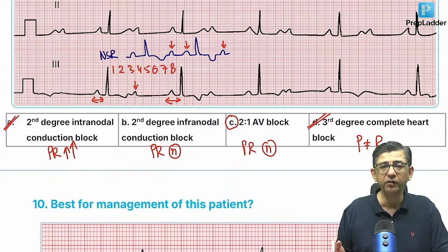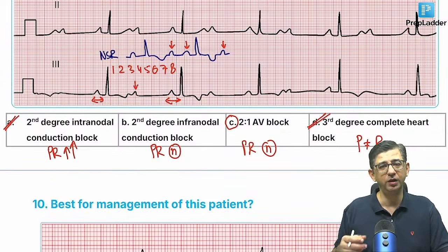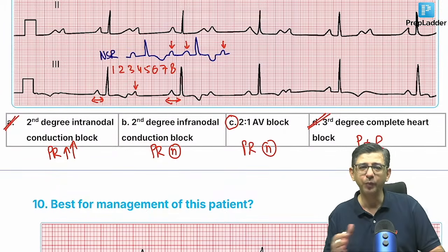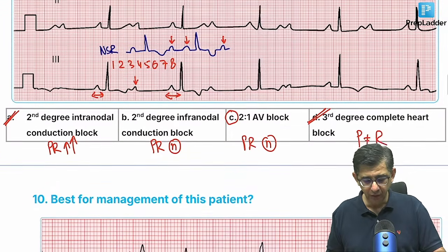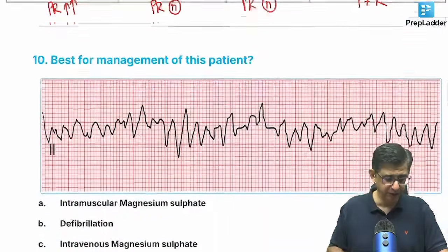सो व्हाट आई कैन सी इज इधर ये क्वेश्चन होगा मोबिट्स 2 पे, या होगा 2:1 ब्लॉक पे. अब क्योंकि इनिसेट आ रहा है भाई, इनिसेट का फ्लेवर ऑफ द मंथ है, तो फिर हम इसको थोड़ा सा एटिपिकल सोच के चलेंगे. सो दिस वन वुड बी 2:1 AV block in a patient. The correct answer is option number C for the 9th question.